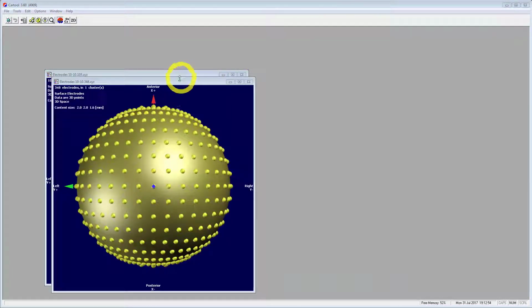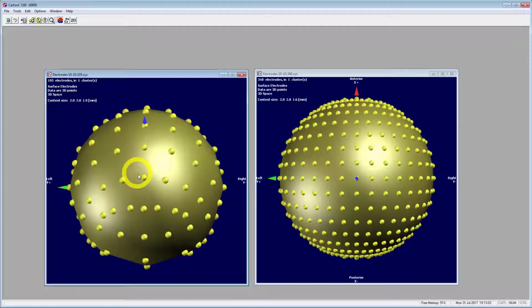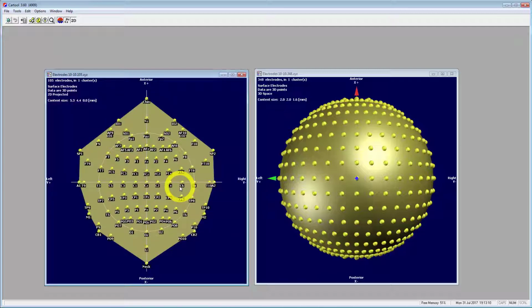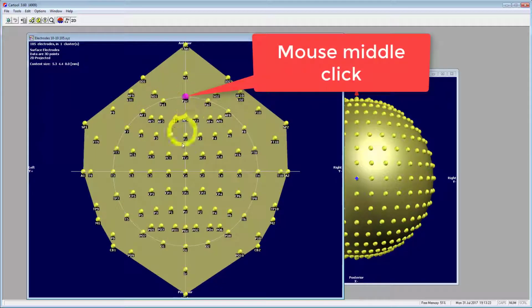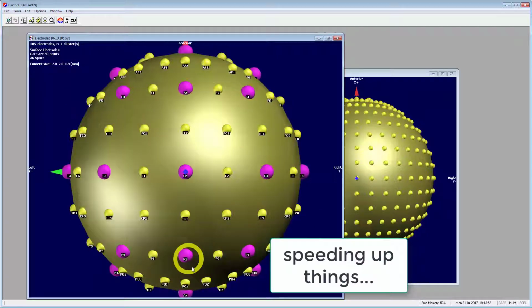Third and last scenario, you don't have any electrodes positions measurement and neither any template. Your last resort until you can fix that is to build an approximate template by hand. Given 105 or 348 predefined positions from the 10-10 system, middle-click on each electrode of your setup. Use either the name of the electrode or its approximate position on the scalp.